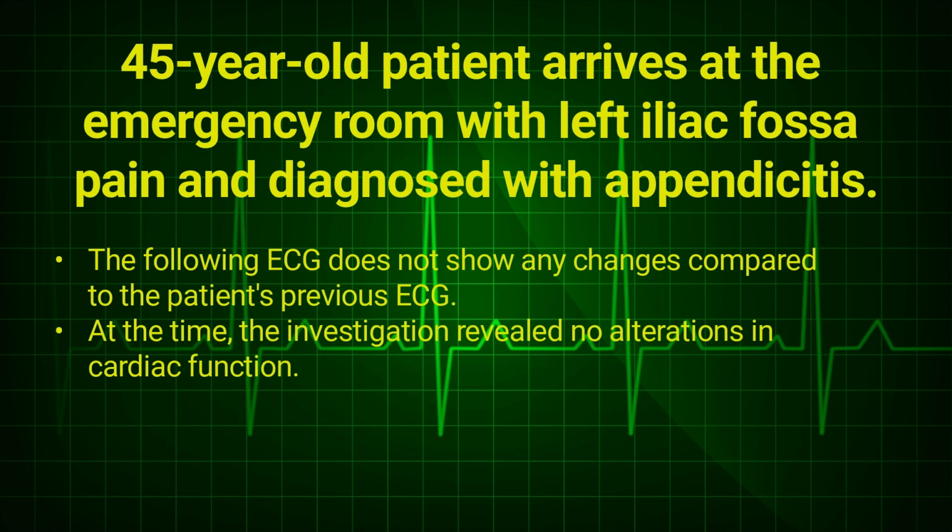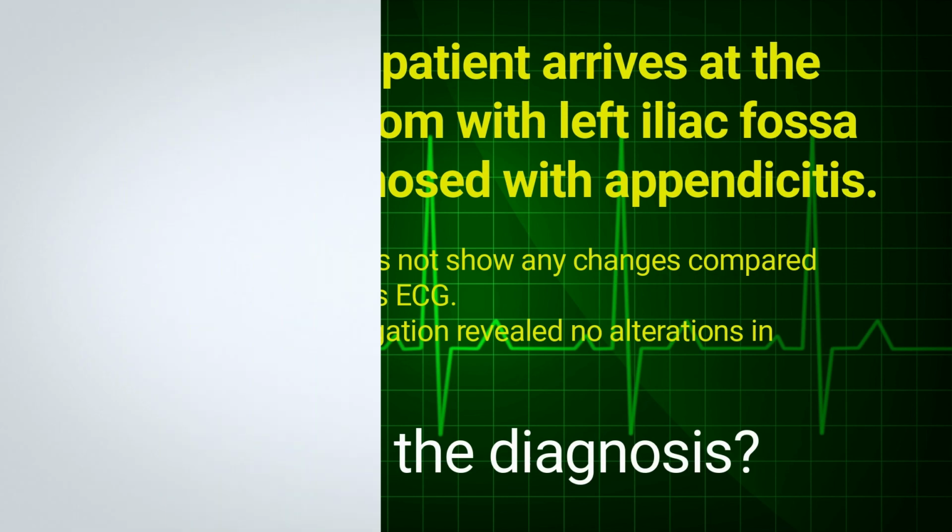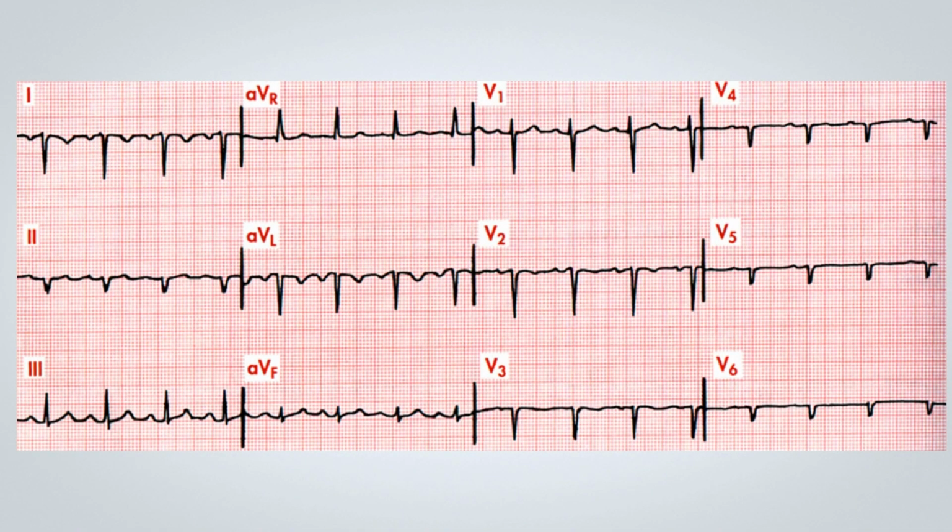Now we repeat the ECG as a preoperative assessment for the appendectomy surgery, and we want to know the diagnosis based on the electrocardiogram. So, what can we observe in this electrocardiogram?